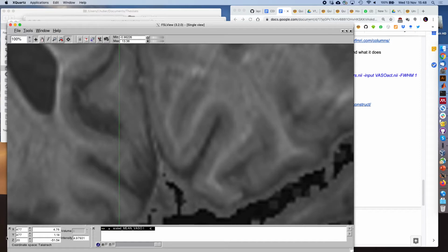This is, I think, similar to what we had earlier. We have our calcarine. So let's draw it again. We need a mask, create mask, and then we draw our ROI with the pencil. We have a fill value 1 and a size 1, and there's really an annoying delay here, so I do it very, very slowly. Earlier, Sean complained about the accuracy here, so I want to do it better now.